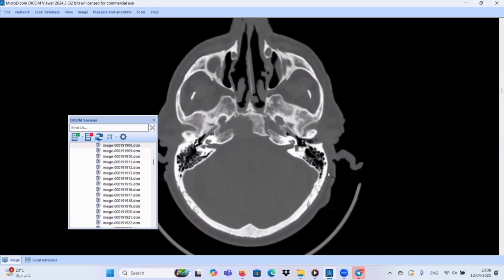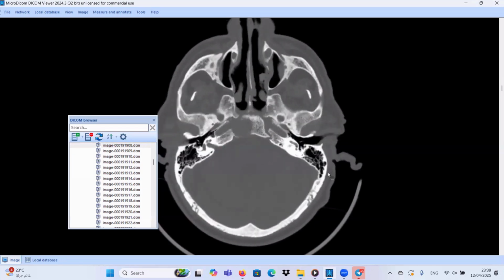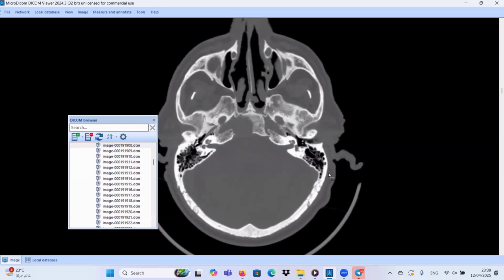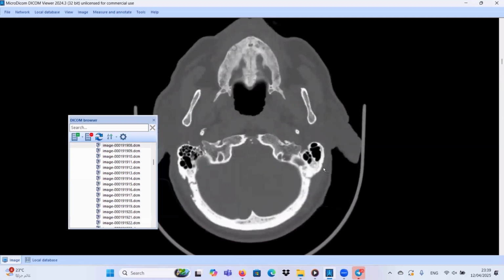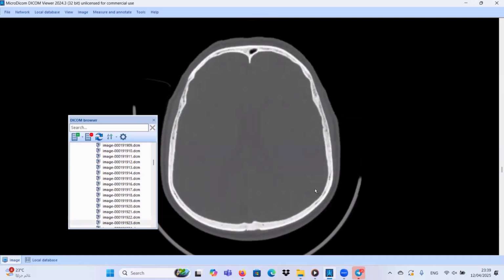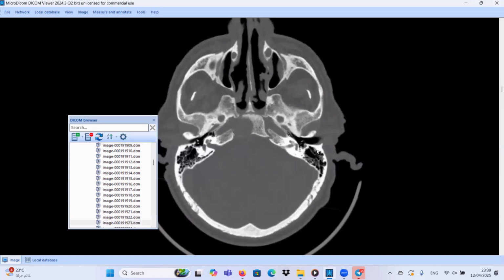But I think the most likely differential diagnosis in this case, a lytic lesion, right paramedian, is metastasis, one of the most important possibilities, and you should raise the possibility of lytic metastatic lesion for metastatic workup. Let's move to our next case.